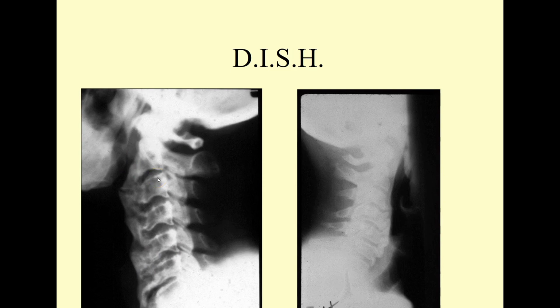Now, this comes with the most common chief complaint, this cervical presentation. That's dysphagia, difficulty swallowing. You can get an idea how far anterior the pharyngeal air shadow is being pushed. And then remember, the pharynx empties into the potential tube of the esophagus down by C5. And again, there's some significant posterior anterior push on the epiglottis, and that makes it challenging. And difficulty swallowing or dysphagia is by far the most common chief complaint. That's really one of the common reasons we go looking for the explanation.